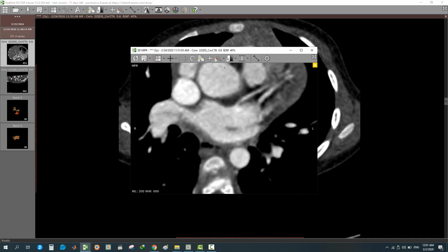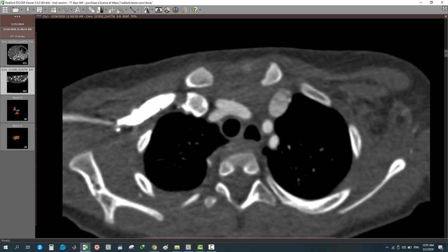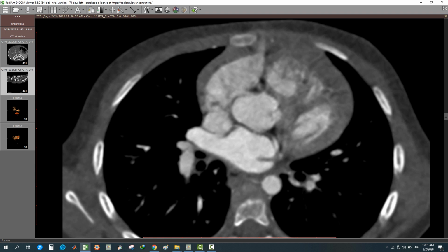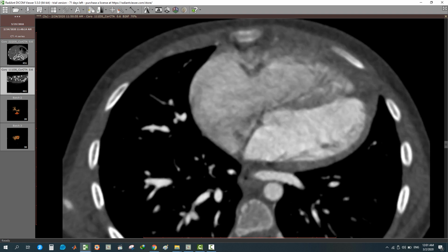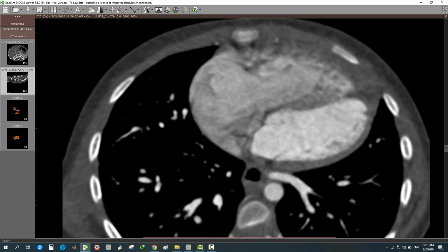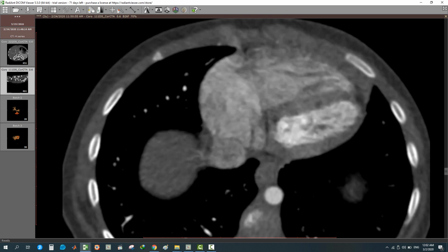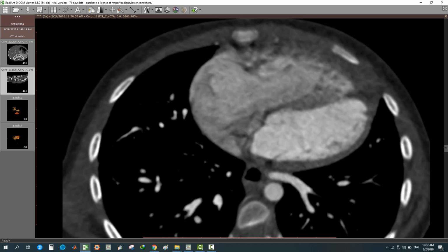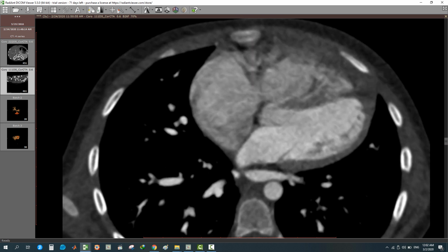And in diastole, as the interventricular septum is being stretched, any small defect will be more clear or can be easily detected. These are not VSDs. This one may be a VSD. This one is highly suspicious. I will see it in the short axis. This one, okay, and maybe this one, tiny muscular VSDs. I will check it again.